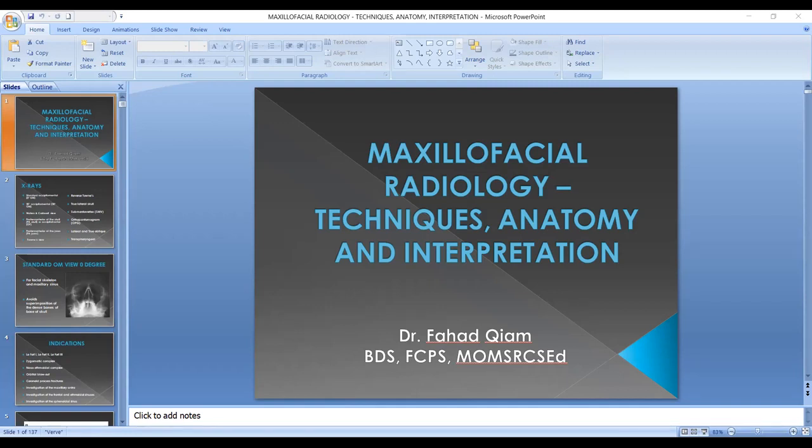All right. Assalamu alaikum, everybody, and I welcome you all to the second batch of the maxillofacial radiology course, in which we'll be focusing on the extraoral radiographs. What are the techniques? What is the anatomy that you see on those radiographs, and their interpretation, inshallah, which will be done in the final session. So today we're just going to be discussing some of the techniques and anatomy that you see on midface X-rays.